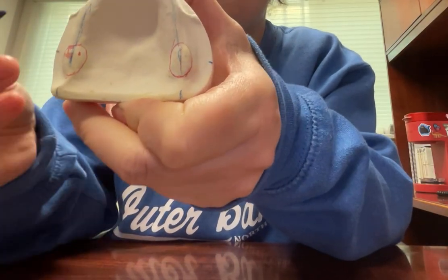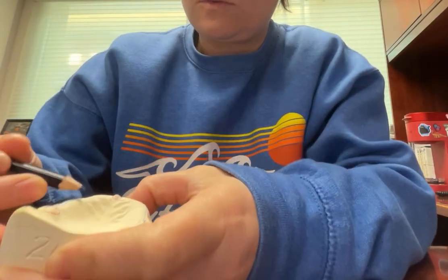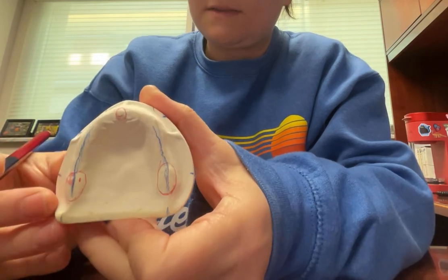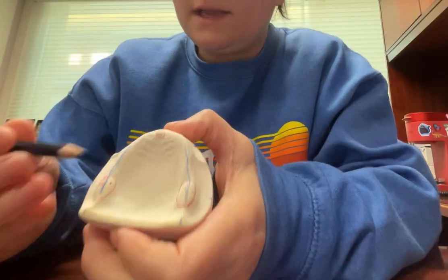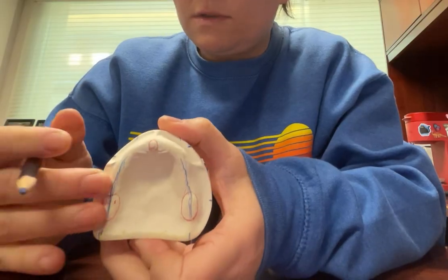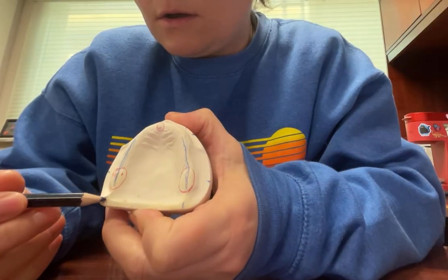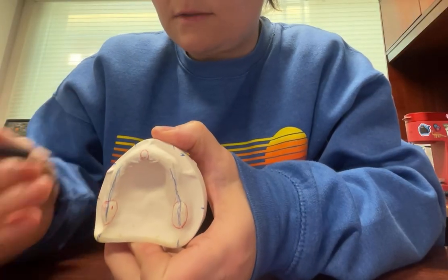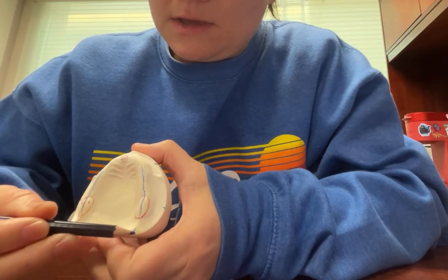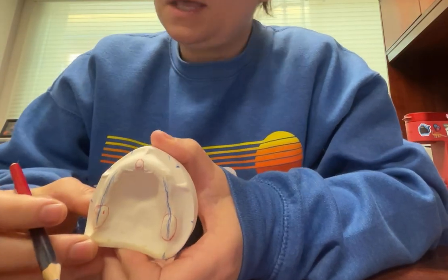The other landmark that you see marked here is going to be the crest of the ridge. So you want to draw the center of the crest of the ridge, and if you just draw your pencil across the top, it'll kind of automatically go to the crest point. So we draw these 2 lines and we carry them onto the cast, onto the land area, because once your record base is over this, you can't see this line anymore. So having this here on the back of the cast and this here on the front of the cast will tell you where that is. And we do the same thing on this side, crest of the ridge, carry it onto the land area at the anterior and posterior portion of it.